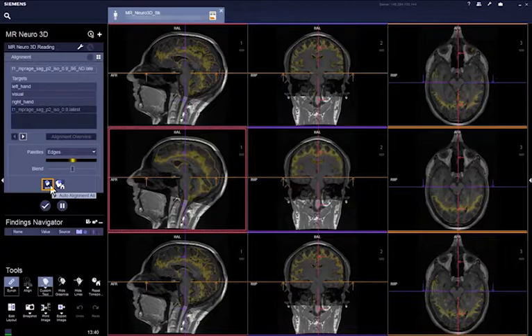In the Overview window, the automatic alignment functionality registers all available bold series to the reference scan. This algorithm works with an iterative approach. Every time the Auto Alignment button is clicked, this further improves the registration until a steady state is reached.